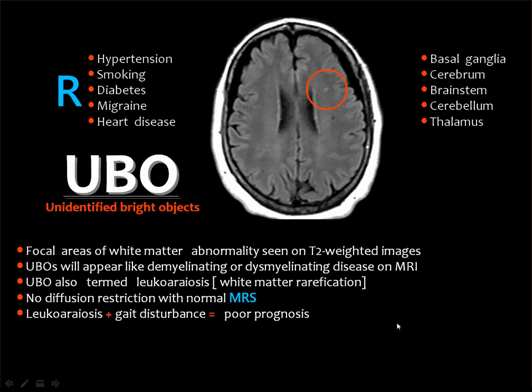The literature says that this lesion may represent an ischemic focus, a dilated Virchow-Robin space, or a demyelinating lesion, and sometimes patients with long-standing headache develop multiple foci in the white matter, which are known as headache-related.